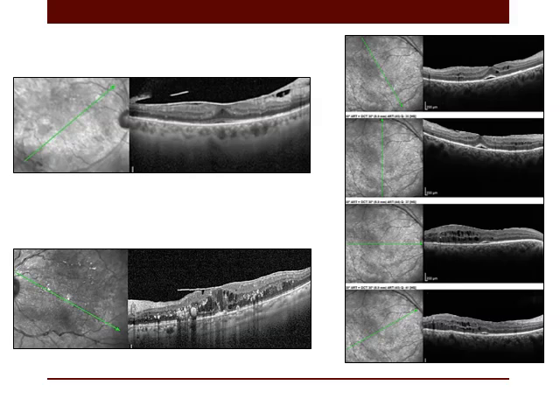A patient with tightly adherent posterior vitreous or epiretinal membrane. There is evident tangential traction. So, the macular thickening in this patient, is it purely diabetic or purely tractional detachment?